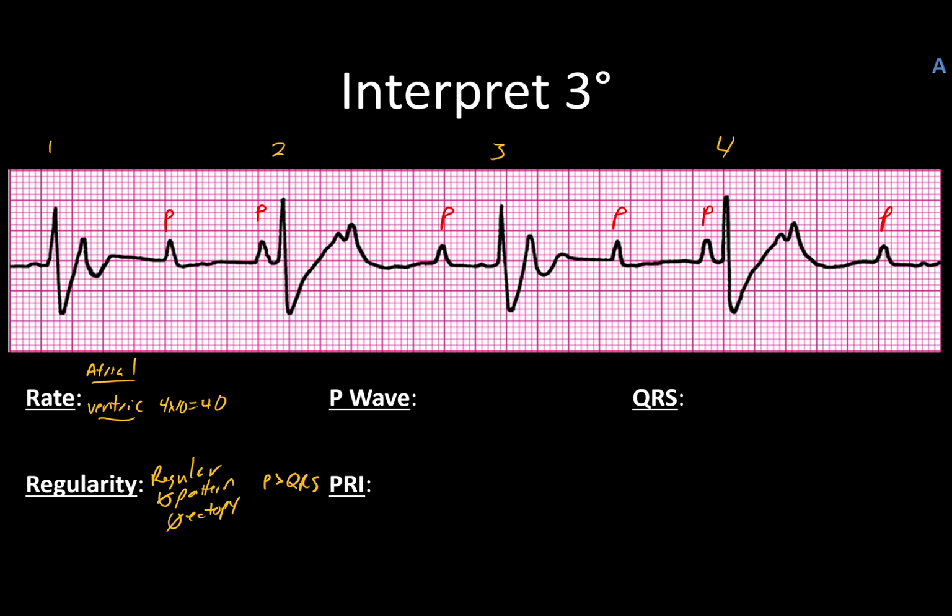Well, that certainly looks as irregular as heck, but if you step back, like really lean away from the screen and just look at this, compare all of those QRSs together, particularly their T waves, and you'll notice that we have different types of T waves. If you look at beat number 2 and beat number 4, you'll notice how the T wave goes up, comes down, goes up again. Now, if you look at the position of the other P waves, that might explain why it does that. So let's do some cool stuff.